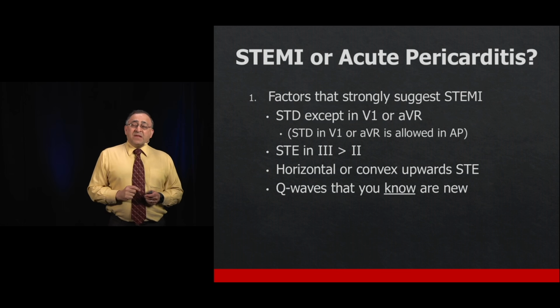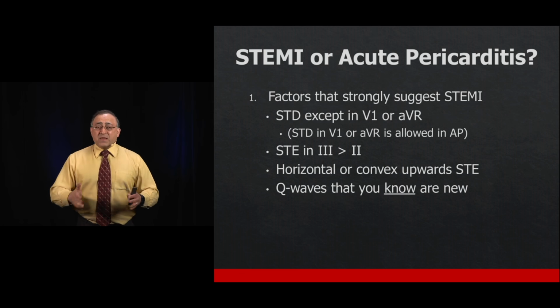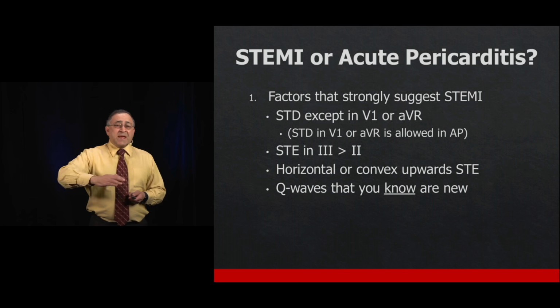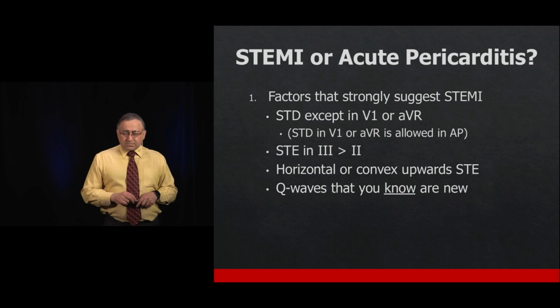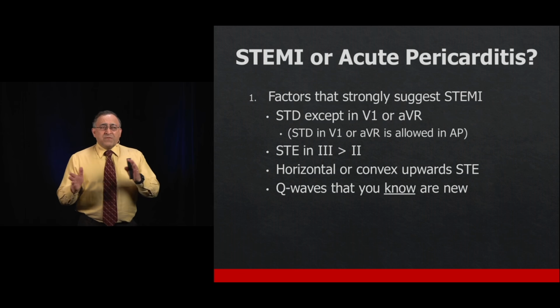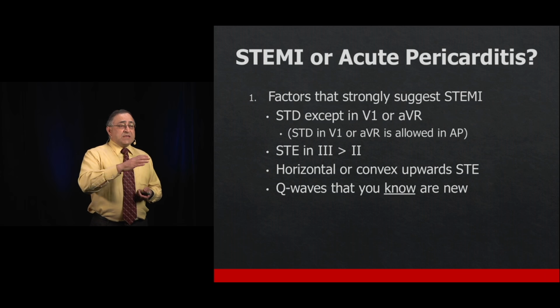If there's any ST depression in any of the other 10 leads, stop, you're done, it's a STEMI, move on. Don't look anymore if you see ST depression in any of those 10 leads. If that doesn't do it for you, move to the next step. The next step is, is there ST elevation in leads 2 and 3?